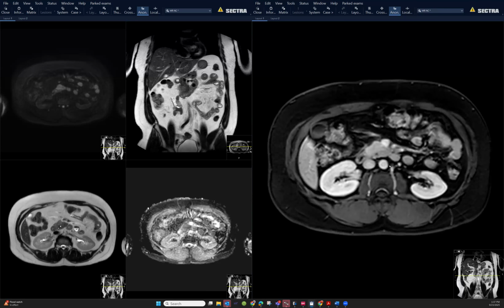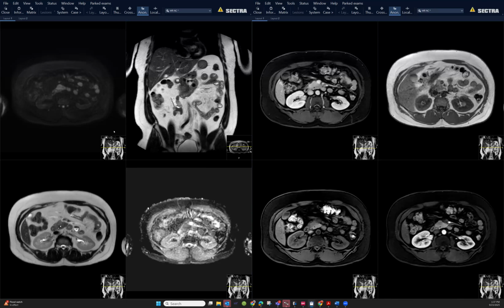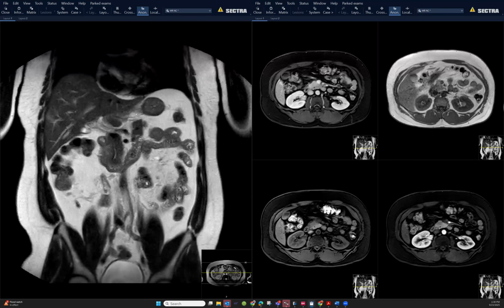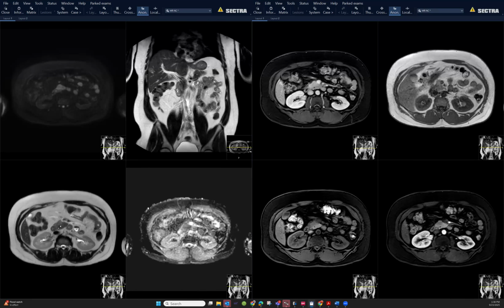So now the question was, it was read as, okay, what do you guys think? Can you zoom in on that coronal HASTE? Sure. T2, it is evil gray, so like pancreatic. Yeah, I mean, I think it needs a biopsy. Agree. So basically they were told he can't have a biopsy for 6 months because he's on these blood thinners. Anyway, it's also restricting. In addition to adeno, think about neuroendocrine, because it has a lobulated kind of border too.